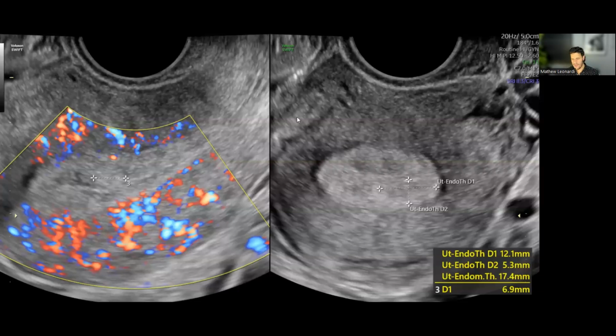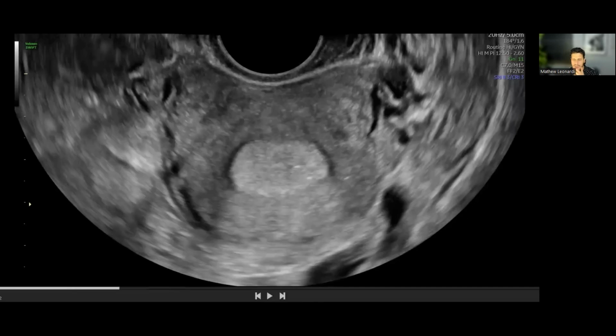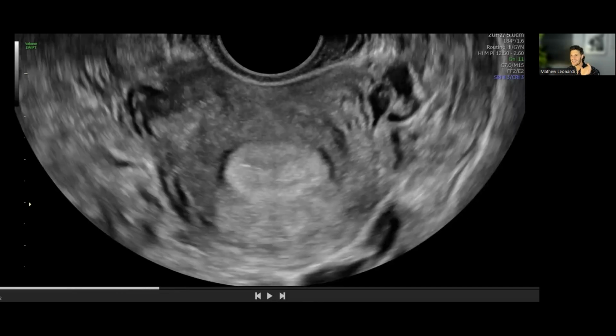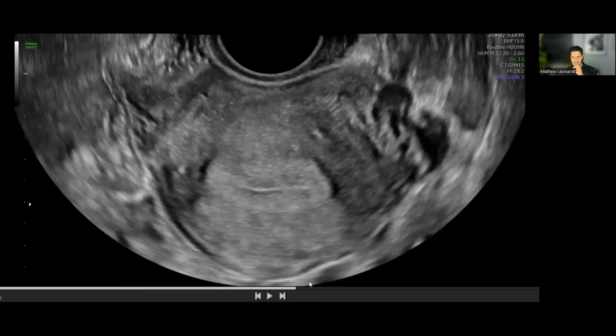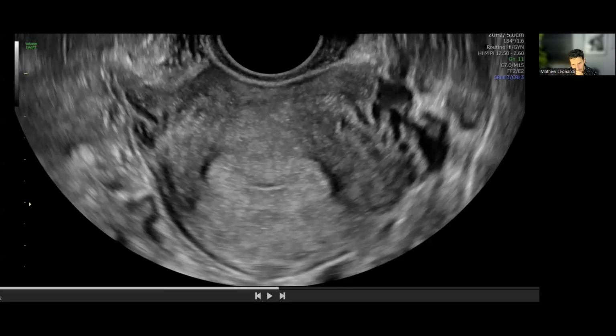Aha, so yes, they have measured this structure here. This definitely I see as the area in a sagittal view. Interestingly, on this transverse view, what we're measuring looks more in the posterior aspect than in the anterior aspect. So not as convinced that this is actually what we're supposed to measure. Let's see, if we pause this transverse view, you have to remember when we're reporting, we're just seeing tidbits of what was captured by the sonographer in real time. So they really are the person who should be the main person to detect pathology.